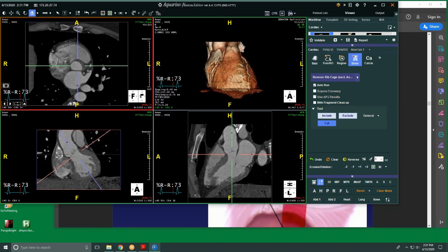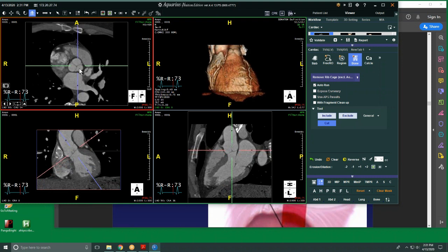See here coming in, right below we call the aortic annulus. It's really not a very well-defined structure. It basically occurs right below the level of the aortic valve. And this is your aortic valve. We call these the sinuses of Valsalva. There's one of them corresponding to each of the aortic valve cusps, okay?